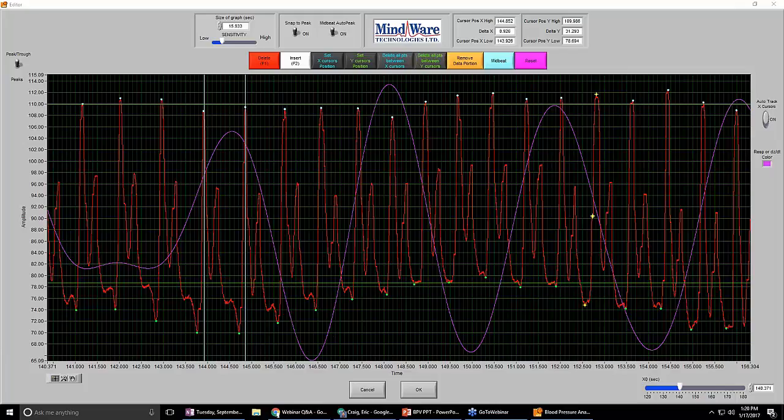So basically, one thing you can do is just manually track it. If it's something that you can see very clearly, like we have the waveform here, and you're just deleting these peaks right here, I wouldn't consider that anything like the 10% rule. It's very much when you're having to extrapolate or guess where those peaks are that you would have to consider that part of the 10% rule.